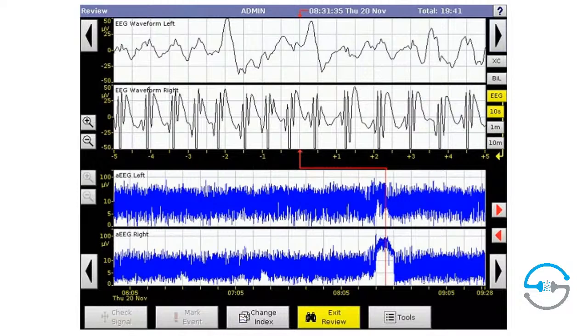So we're looking for a rise in the upper and the lower margins. We're looking for a thinning of the band, representing that the voltage itself is actually becoming more similar. There's less variability from beat to beat to beat in that 15-second window. Remember that the bandwidth of any aEEG is a representation of the variability of your aEEG voltages, your brain voltages.